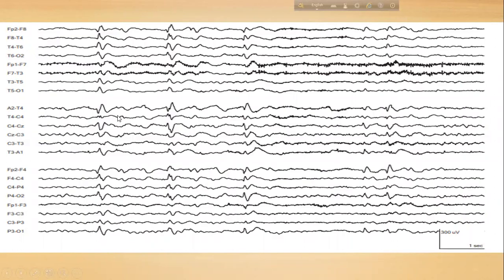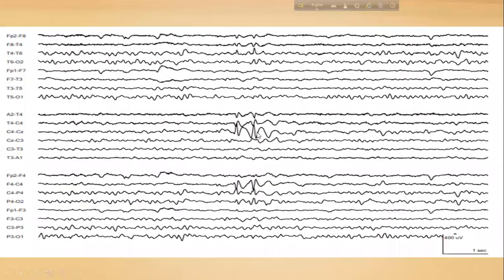This is another EEG showing again a sharp transient. So this is ascending, and it is biphasic with sharpened morphology, and asymmetry is present there. The wave duration is also different, and there is a slow aftergoing activity. So we can see here also there is another EEG which is showing a biphasic transient.